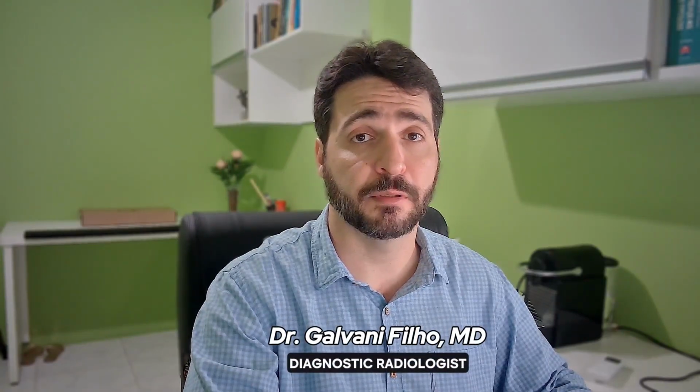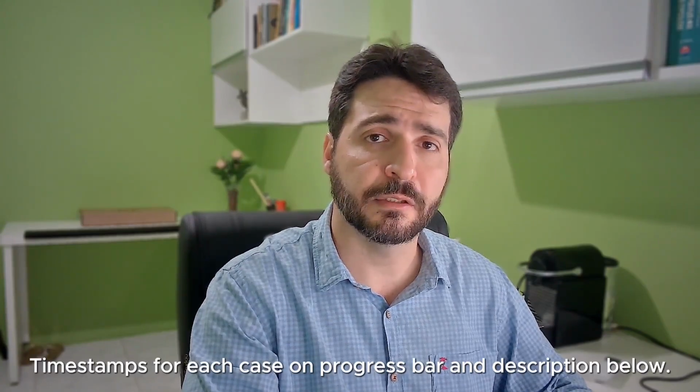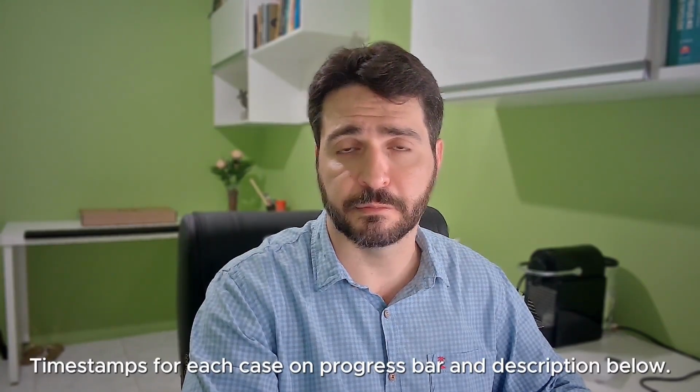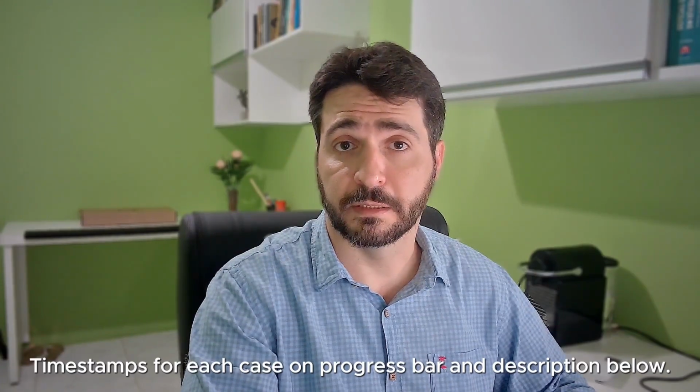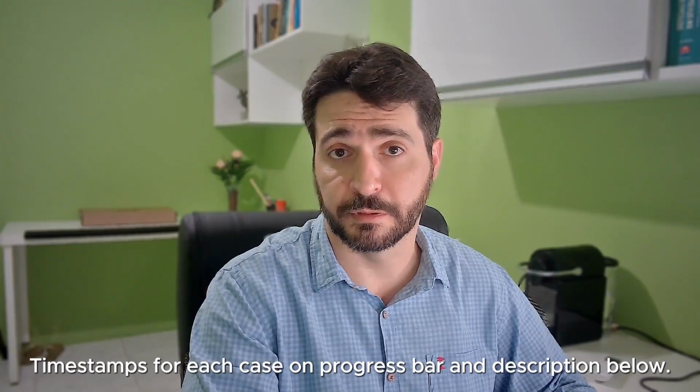In a few moments I'm going to share the screen of my workstation so we can read and report some CT scans from the emergency together. We're going to roll the images, look for pathological signs of disease, and eventually reach a diagnosis for each and every case we read. Then I'm going to write down the report and comment on terminology, what is important for the referring physician, what should and shouldn't be on the report, and so on. So if that's what you're looking for, stick around and let's get to the first exam.